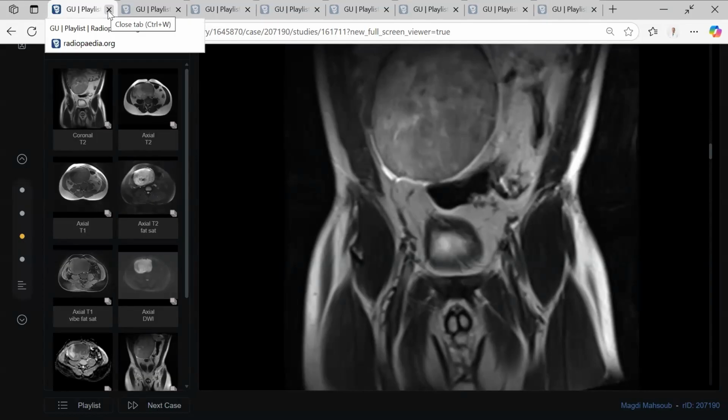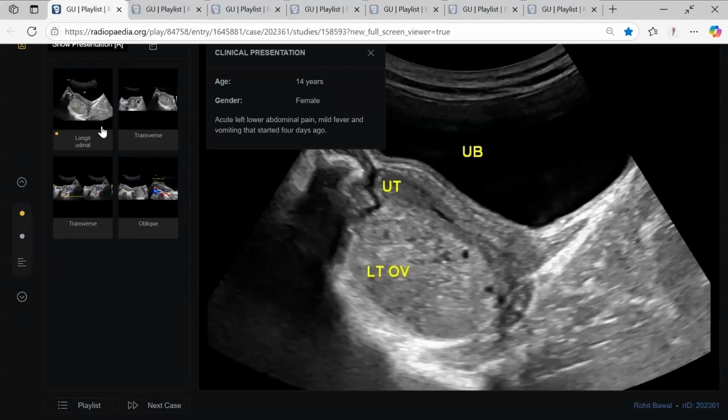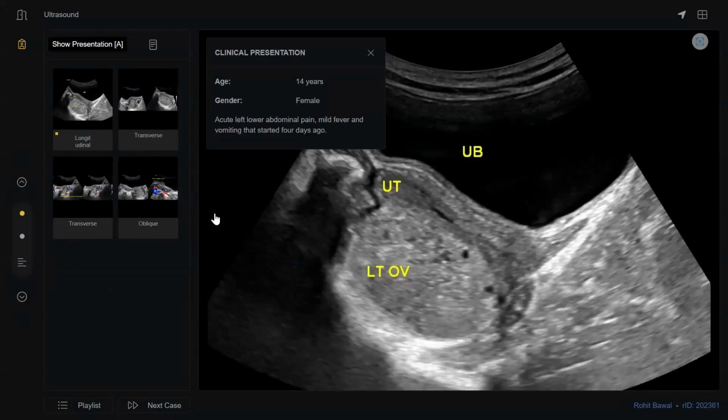What type of metastasis, chest metastasis of seminoma, doctor? Lymph nodal. Chest metastasis has a characteristic appearance in case of seminoma. Cannonball. One of the cannonball is a seminoma. The next candidate, 14-year-old female patient with acute left lower abdominal pain, mild fever, and vomiting for 4 days.